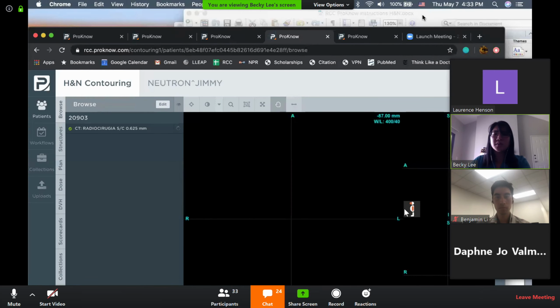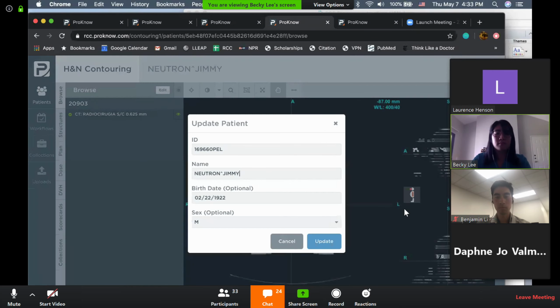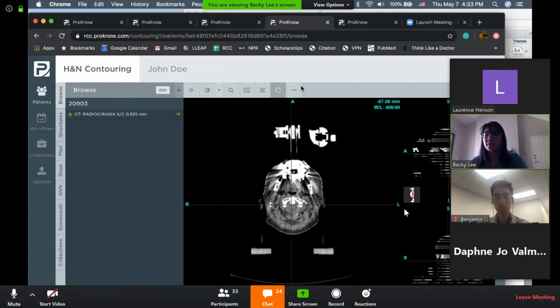And because we don't want everyone to see that his name is Jimmy Neutron, what you can then do is go to actions, and you go to edit, and we can change his name. So we can call him John Doe. And then we can change his birth date or take that out, or his gender, we like to have their gender, but you can leave that there too. Okay, and then you can update, and then it becomes John Doe. So now you don't have the person's name there anymore.